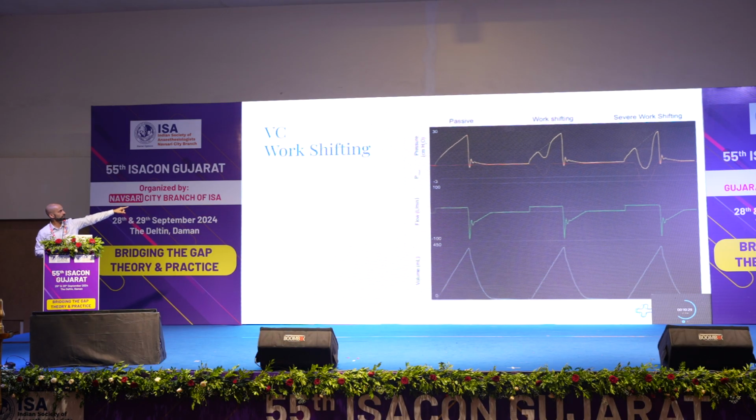So now you are looking at pressure time. If the patient is completely passive, you are going to see a waveform like this, exactly like you would see in the textbook. If there is effort, effort is denoted by this red tracing. Red tracing shows the PMUS, negative pressure inward. This is called flow starvation. But work shifting is the broader term that applies to both modes.